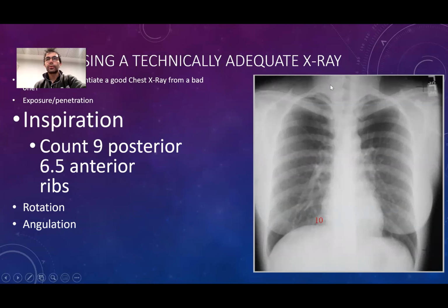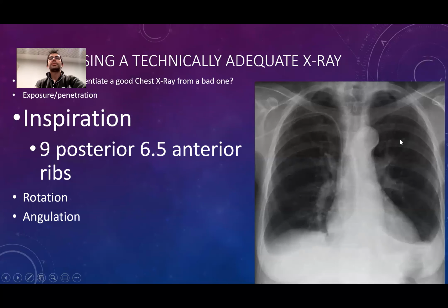I'm counting from the front now. The front is more oblique, going to the front area to the sternum. This is the first one. 1, 2, 3, 4, 5, and 6. It just intersects with the middle part of the diaphragm. So this is good inspiration.